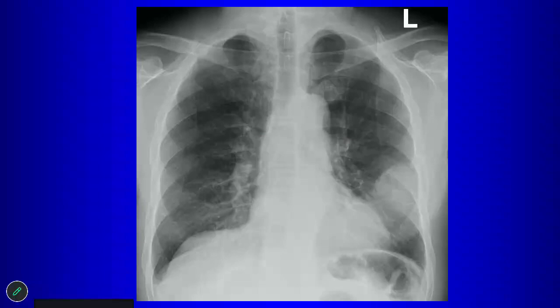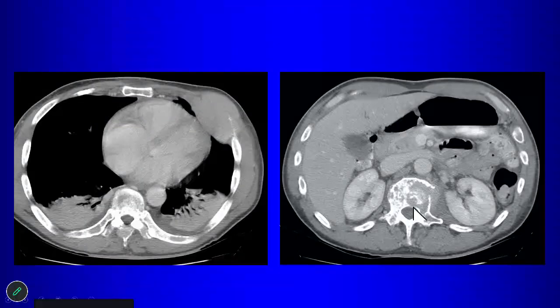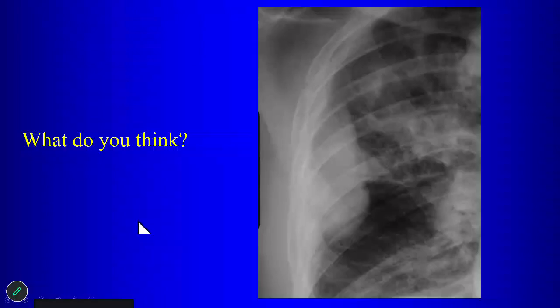What about the anterior ribs? Number 1, 2, 3, 4, 5 might be expanded anteriorly? All right. Do you see this anterior rib? No. So we're used to very carefully looking at posterior ribs, but you also have to look at the anterior ribs, right? The anterior rib here is missing. That's another metastatic lesion. That's a big met to the anterior rib. So these are the things you look for on the chest radiograph when you're looking for bone destruction. Be careful of the anterior ribs.